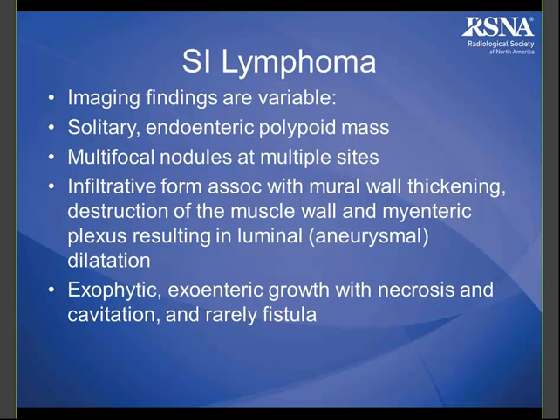And when we see that with abnormal areas of wall thickening or aneurysmal dilation and maybe adenopathy adjacent to it in the mesentery, we're definitely thinking of small bowel lymphoma. And we've also seen small bowel lymphoma in our transplant patients as well. I've had even recently a case of a post-lung transplant patient who, like 8 years later, developed small intestinal lymphoma, biopsy proven. So we see it in the post-transplant lymphoproliferative setting where it can affect the GI tract.